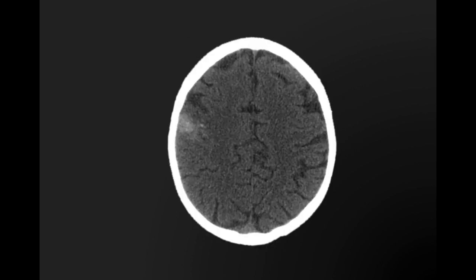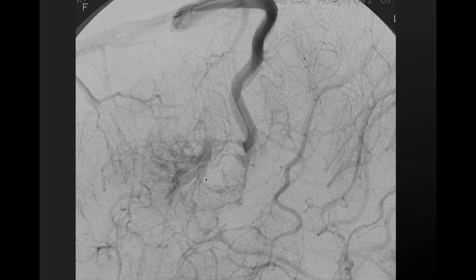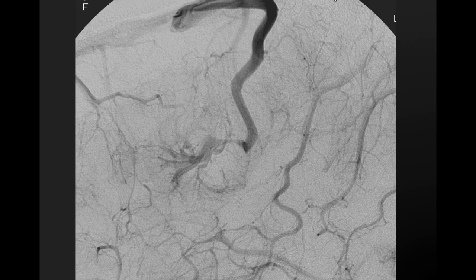We see that there's this focal hemorrhage right here, and then there's this DVA which appears, but it's during the early arterial phase. We're seeing that there's these shunts that are happening in the periphery of the DVA, and then we see that there's this DVA right here, and then there's probably like a little stenosis of the DVA itself. So this is a nice example of a transitional venous anomaly. And then you can see in the normal cerebral venous phase how it's draining the normal brain as well. And you can see the DVA with its stagnant contrast column.